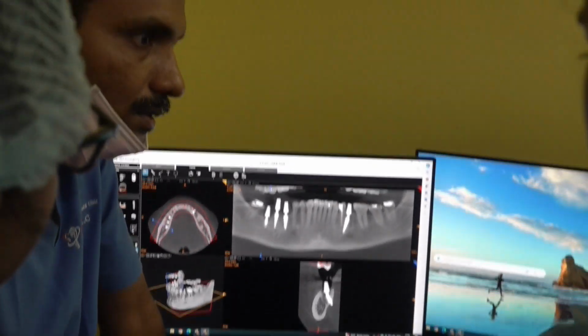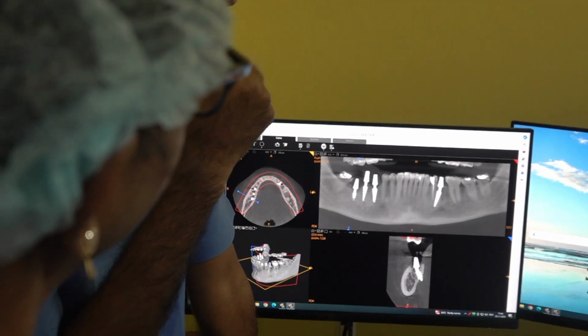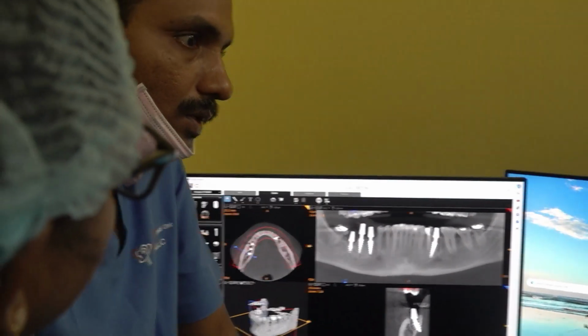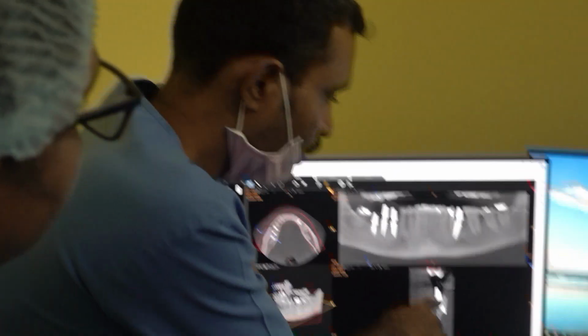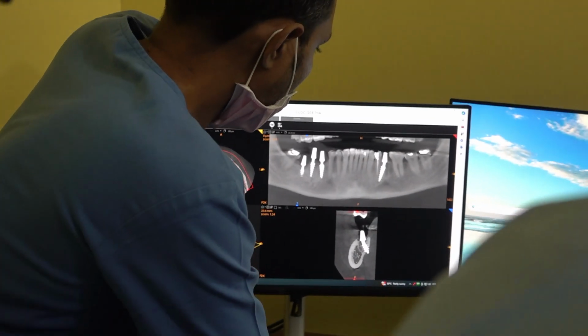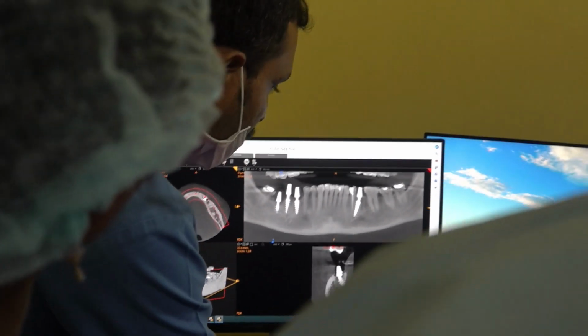Why do we do that? For length, the abutment was very deep. You can go and check now. The abutment got submerged too much. If you have selected 12, then the length of the abutment, yes, length. So length calculation is very important. But of course, there is enough length there.